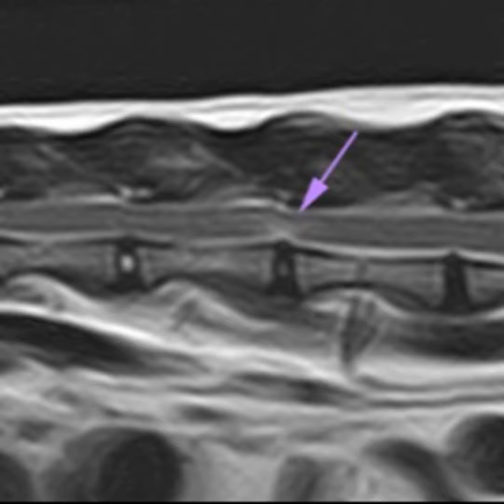Okay, great, thank you. I'm going to take one more question for you from Bulgaria, from Mitko. Have you ever seen a disc protrusion at T3, T4 in this study? No, we didn't find any disc herniation in the upper thoracic spine of the cats.